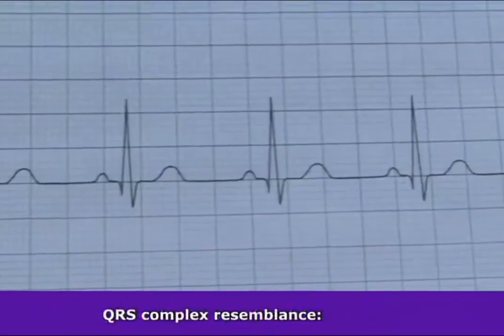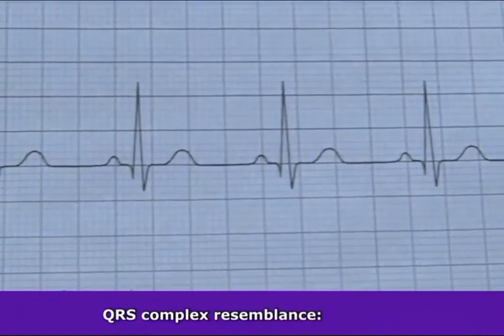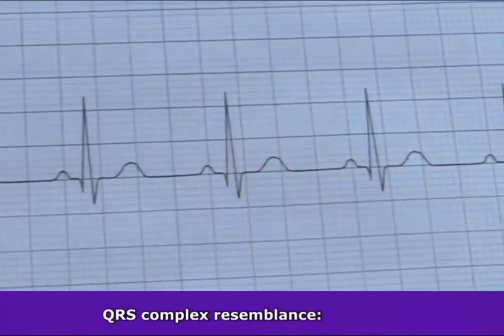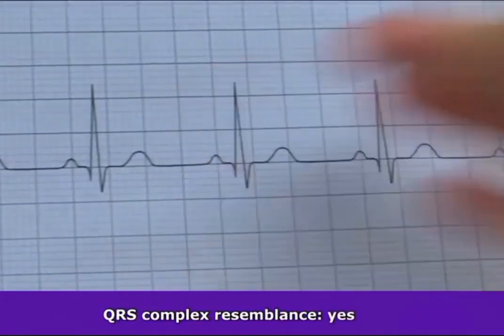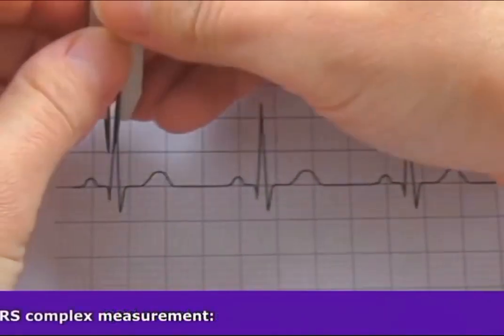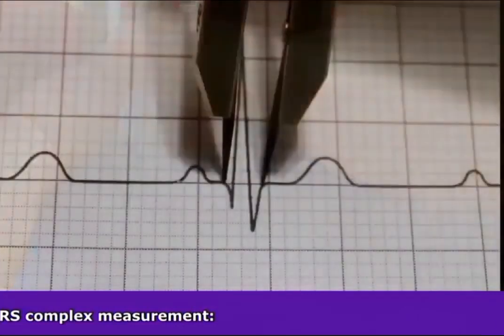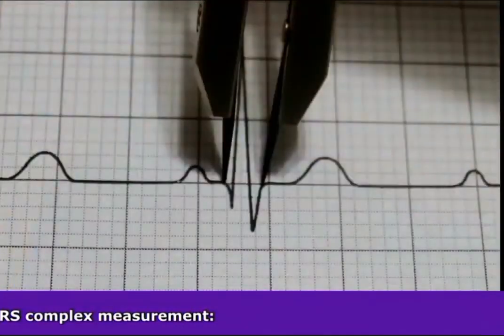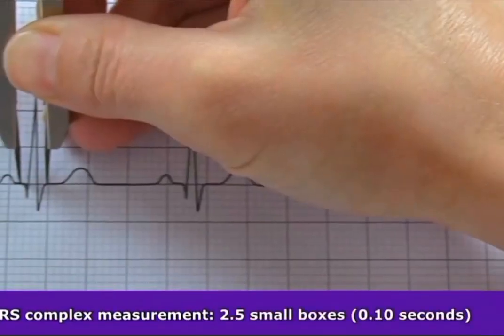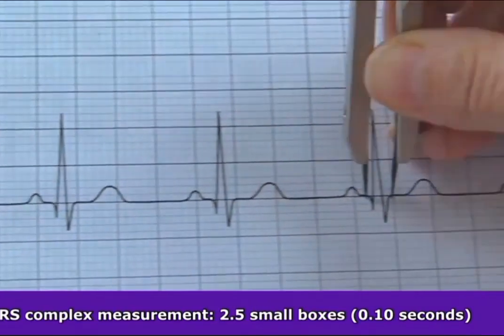And then lastly, the resemblance. Do these resemble QRS complexes? Are they where they're supposed to be? You're supposed to have one QRS complex after each P wave. They do. And they look like QRS complexes, and let's measure them. So what we're going to do is we're going to measure at the beginning of the QRS complex to the end right here with our calipers. And when you measure it out and you count the boxes, you get 2.5 boxes, which is about 0.10. And then just go down through the strip and just measure to just confirm.